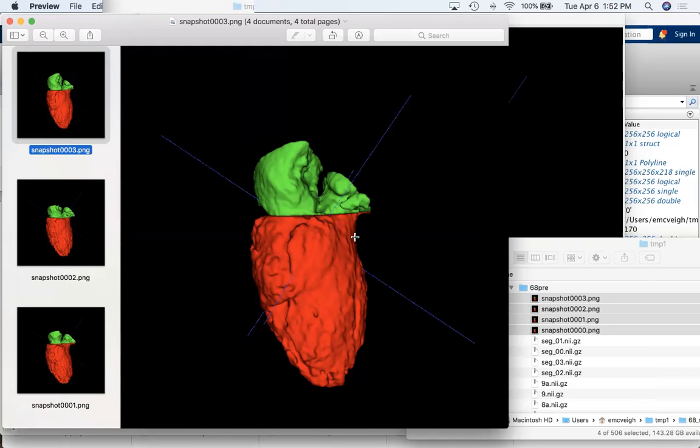And in the data that I had for training, there was a kind of thicker region there of 2 colors, no? Oh, you still have to do the outflow tract. Yes. So then we'll do that one next.